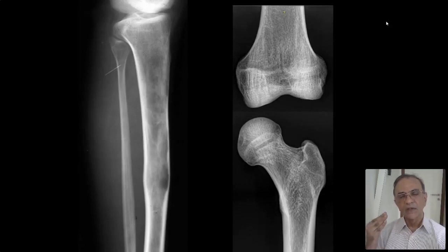So this is a way of illustrating normal bone and abnormal bone. If you look at the femur on the right, the lower end of the femur and the upper end of the femur, you start admiring how human evolution has happened. Now we went bipedal, 4,000, was it 4,000? Something like that, I don't remember now. 4 million years back, yeah. So look at the trabecular pattern of the lower end of the femur. They are all vertical. I want you to look at the trabecular pattern of the calcaneum, the trabecular pattern of the vertebrae. And of course, you look at the trabecular pattern of the femur.